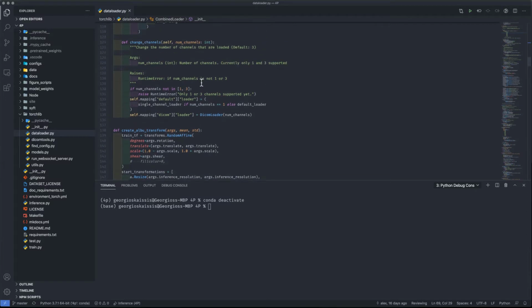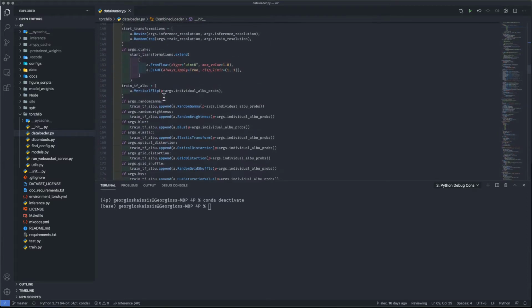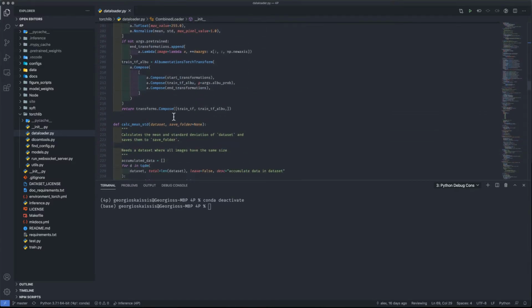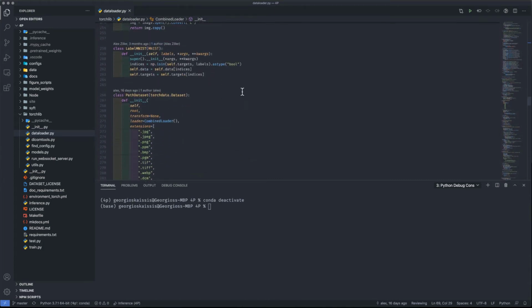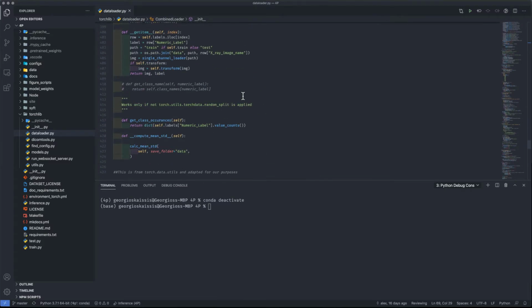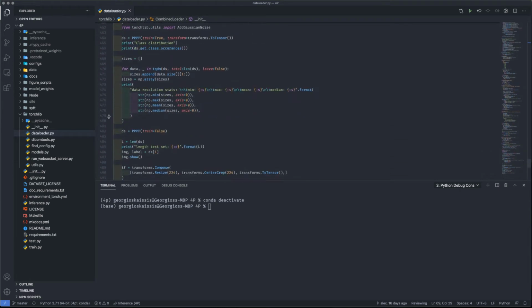And there's some magic here to transform images from 1 channel to 3 channels, and do various transforms. We use albumentations to do transforms, calculate dataset statistics, and there's also some stuff for MNIST, and I'll show you how to work with MNIST in a bit. And that's basically this module. You probably won't need to do very much in here.